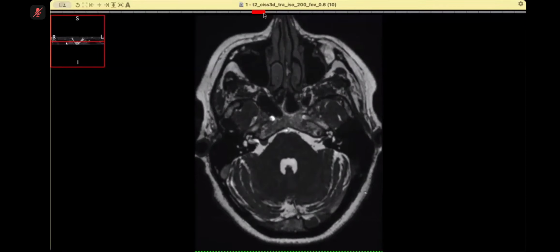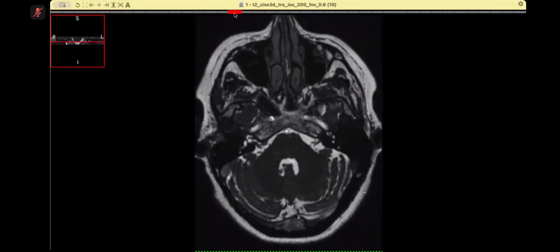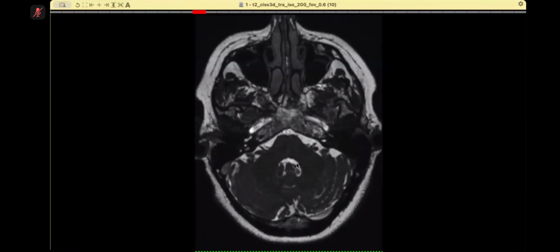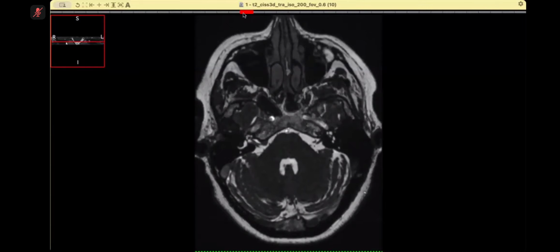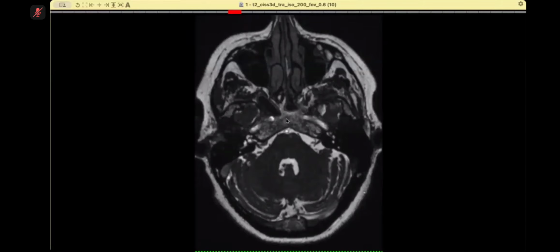And in relation to the facial nerve, where is the facial nerve? Can you show me the facial nerve? Yes, sir. I'm trying to locate. So this is the vestibulocochlear nerve, and this one is the facial nerve, and it might be arising from the facial nerve. So it can be a facial nerve schwannoma or something compressing it. What will you like to do next?